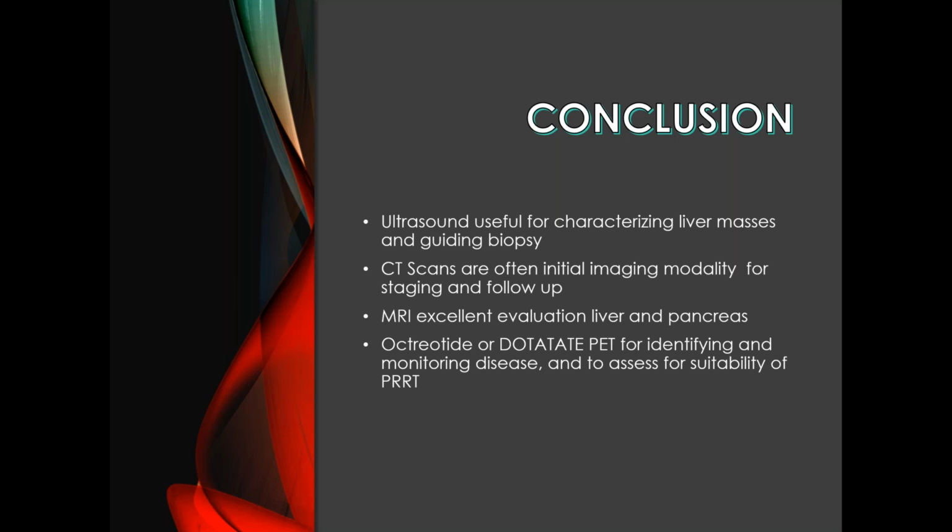So at the end of the day, the surgeon is actually probably better at detecting a lot of the tumors than imaging. We try to do our best, but obviously we will still miss things. Maybe if things get larger, we would pick up the tumor, or it could just be that it's not DOTA-TATE avid, because not all tumors will be DOTA-TATE avid. In which case, then another PET test, such as an F18 DOPA, might be able to pick up the tumor.